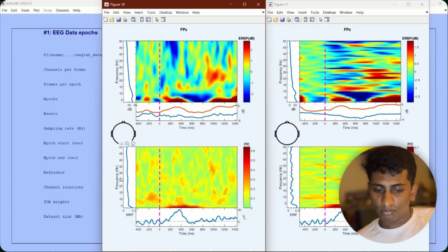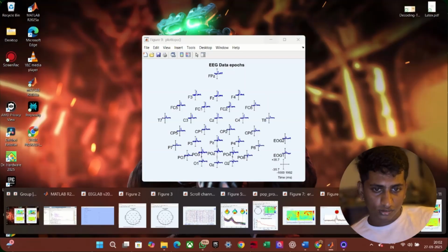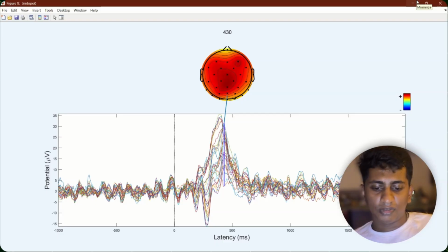So we'll be going for the ICA parameters. ICA separates the sources: x equals A S, solved by W, such that S equals W dot x. So I'll run ICA now. You'll get an idea. Basically, the scalp map is the ICA. So this scalp mapping is also called ICA, algorithm data and all. And the best practice is to run ICA on continuous data after removing the noisy channels.